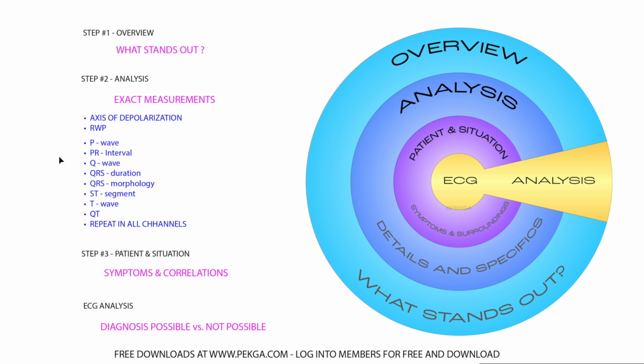on developing your own method. This is something we use at Pekga here. You can use any method, take somebody else's, it doesn't matter, but it's greatly going to help you when you run into difficult ECGs, when you're tired, when you just don't know what you're looking at, or maybe you just don't want to be looking at any more squiggly lines.